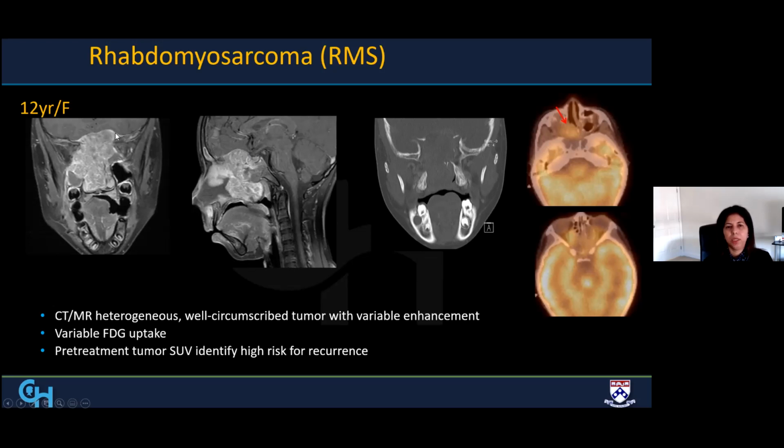If it is left untreated, these can go along the foramina, and they can have extension along the nerves. Perineural extension is very common along the branches of the trigeminal and the facial nerve, depending on the location where they are. Here is a CT that shows the extensive bony destruction. And these are the FDG PET images. This was taken a few weeks after the chemotherapy had already started. And you can see by this time, after a follow-up, that there has actually been decreased uptake.